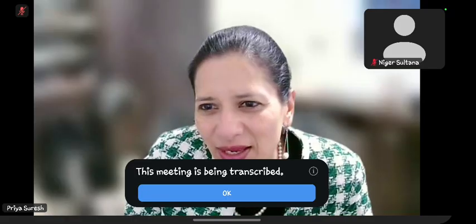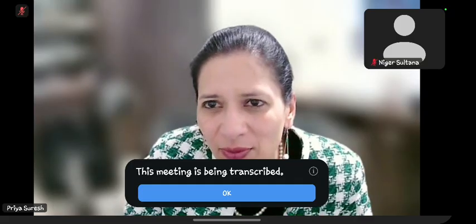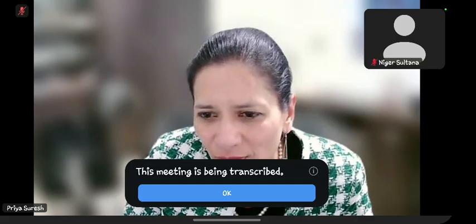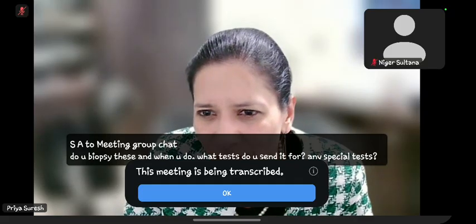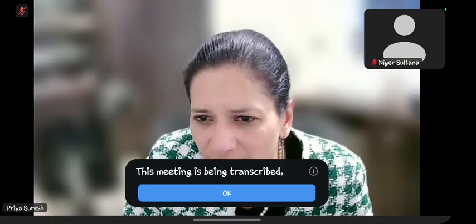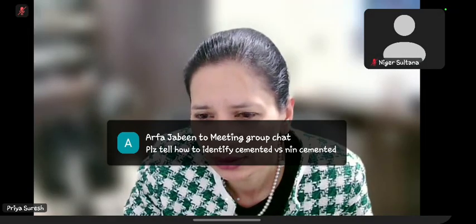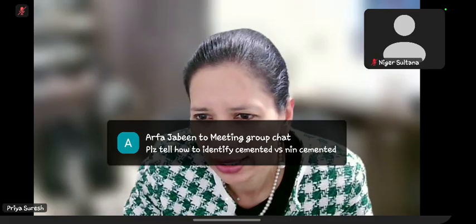Yeah. I was just seeing, are there any questions that people have? Can you read the chat, or should I read it for you? I think I have written cement and cementless on image, please. Okay, what is the diagnosis?